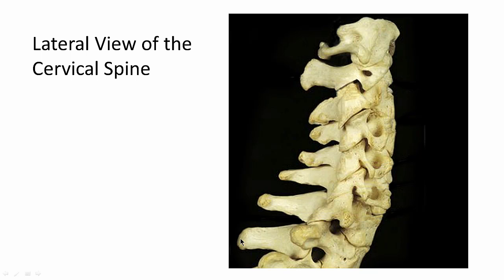T1, which has the biggest spinous process in this specimen, is, well, this is T1. You can actually see the costal tubercle right here, a facet for the rib articulation. Let's see what we can see in parts, because that's what you probably care about, what's going to be on the test. So here's a transverse process of atlas, spinous process of atlas, posterior arch of atlas.